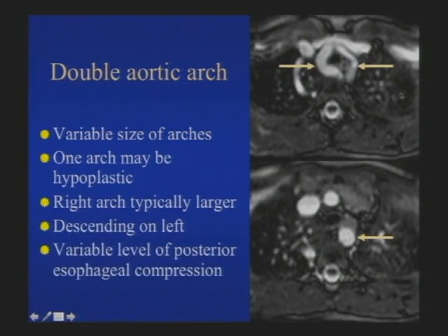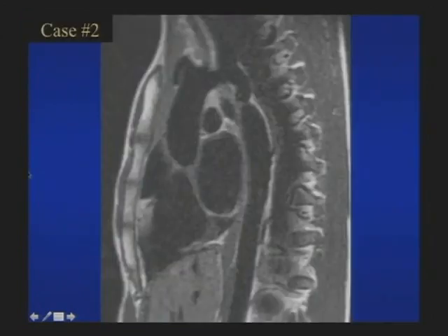And so on the esophagram, you may see compression which is high up, or in the mid-chest, or even lower down, depending upon where it crosses over. So this is a black blood image. Again, as we keep it simple in MRI and cardiac MRI, the blood is black, so we're going to call it black blood. This is a double inversion recovery sequence. We intentionally make the blood dark. And I'm not going to get into the physics of that because it's beyond the spectrum of this.